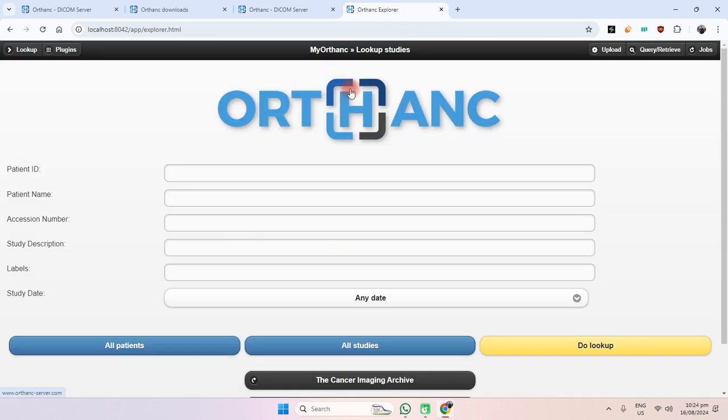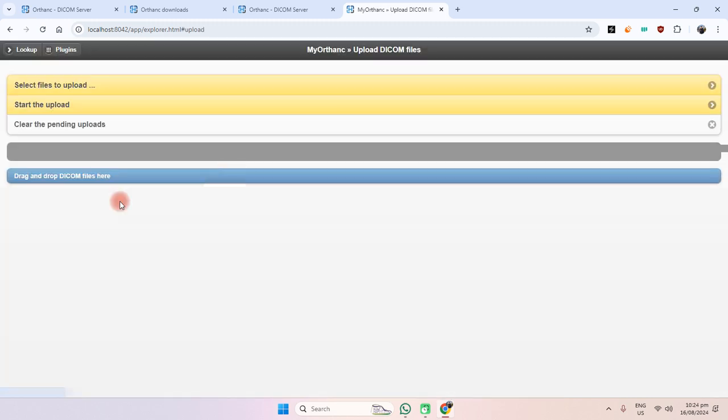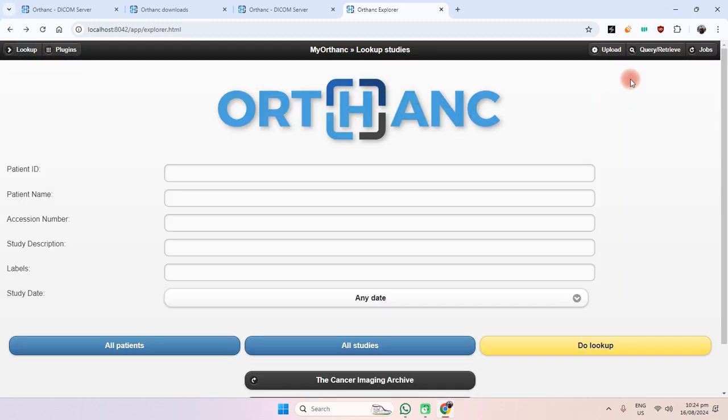So this is it, and this is completely easy. You just need to open the Orthanc website, download the Orthanc installer, just install it as I have instructed, and upload studies and just start viewing. That's it. Thank you, hope you like it.